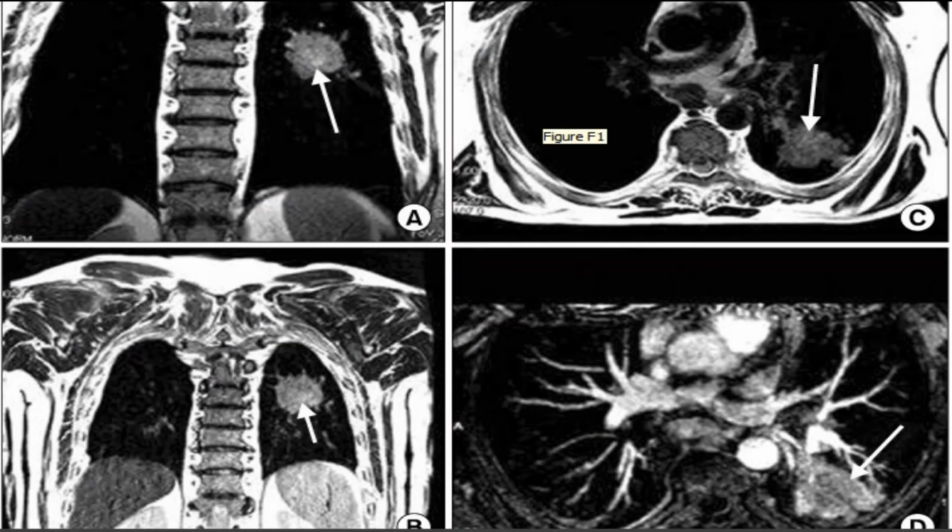This is in a patient where you can find a mass lesion in the T2 image, which is hyperintense. The similar image on the axial T2, and this is the coronal image in the lung window. This is the mediastinal window. So this patient has been given contrast, and in the post contrast you can find there is enhancement of the lesion. So a mass which is hyperintense on T2 with the post contrast heterogeneous enhancement is in favor of bronchogenic carcinoma, which is a contrasting feature of PMF, where the lesion is hypointense on T2.